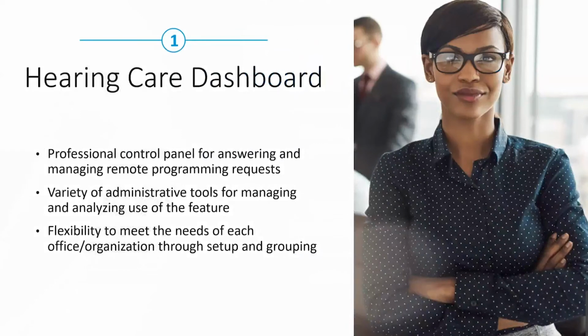The dashboard serves as the professional control panel for answering and managing remote programming requests. So when this is first set up, that clinician who set it up will be the administrator and will have the ability to add in other clinicians that may work at the practice. You can group them together. You can add in multiple locations as well.